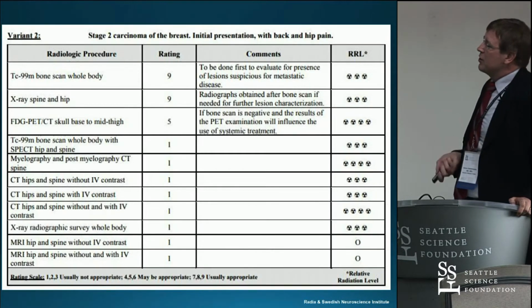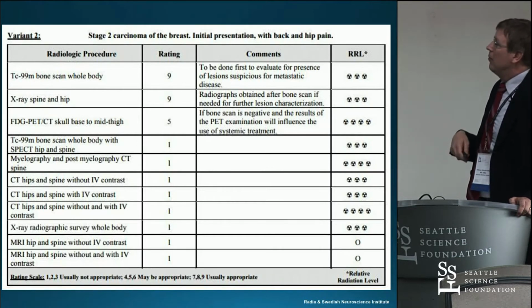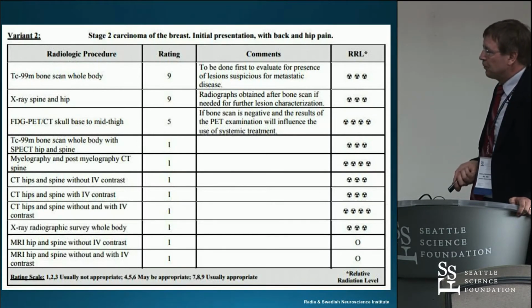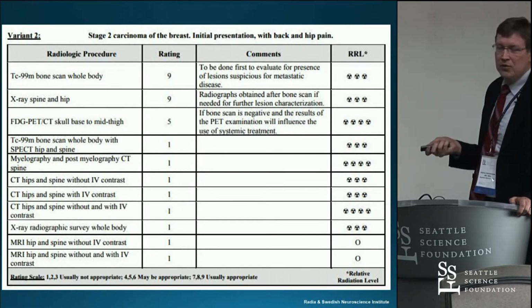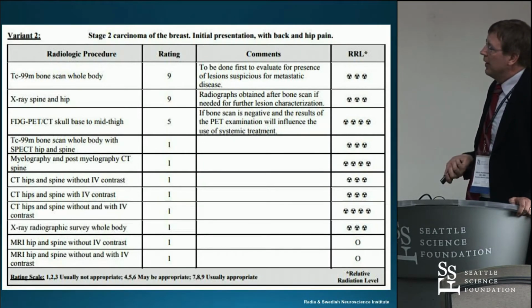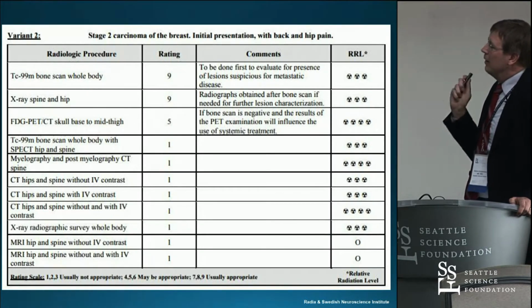Okay, now here's a patient with breast cancer. Initial presentation has back pain and hip pain. The study of choice here that the ACR is recommending you start with is a bone scan. Nuclear medicine bone scan has a rating of 9.